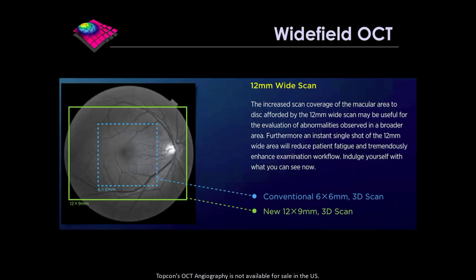So 10 years, 15 years of OCT, we're tending to focus on the macula. And OCT for a long time has been about CNV, cystoid macular edema, fluid in the macula. The exciting thing about the swept source OCT is that you can take a volume scan, which is 12 millimeters by 9 millimeters, in probably less time than it takes to do a 6x6 with the older devices. And I can't remember the exact timing, but it's probably 1.5 seconds, something like that.